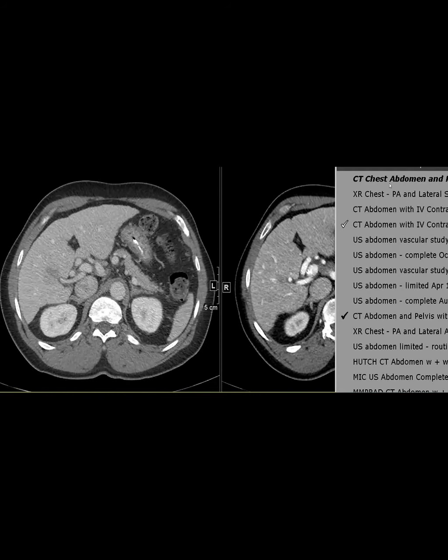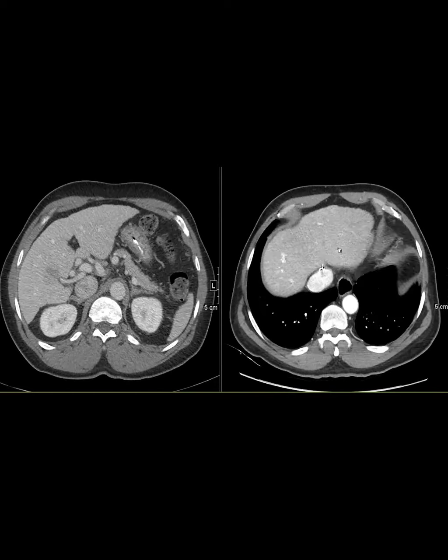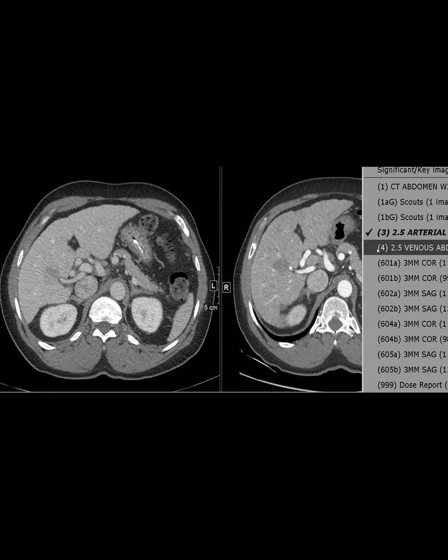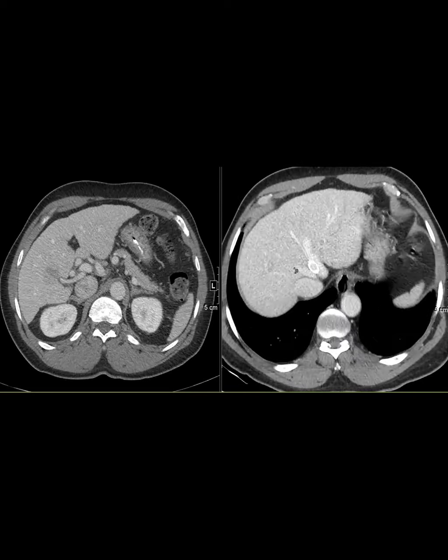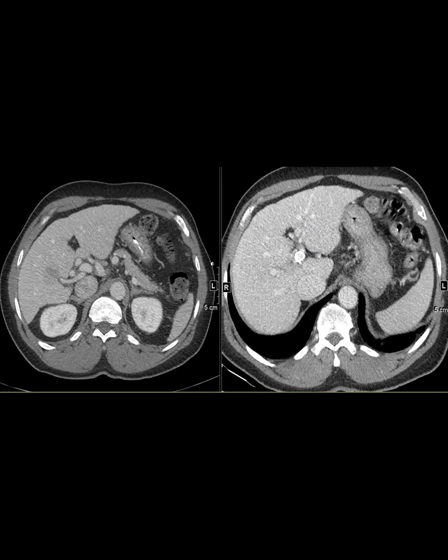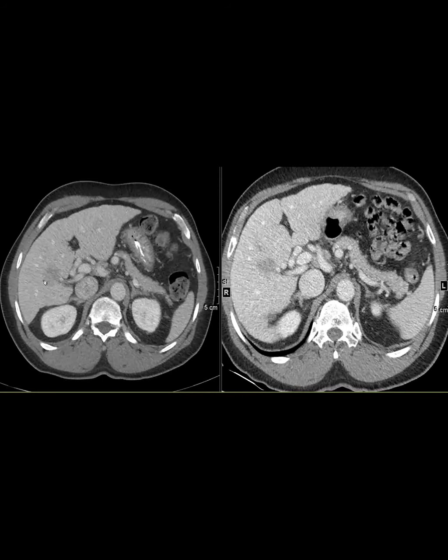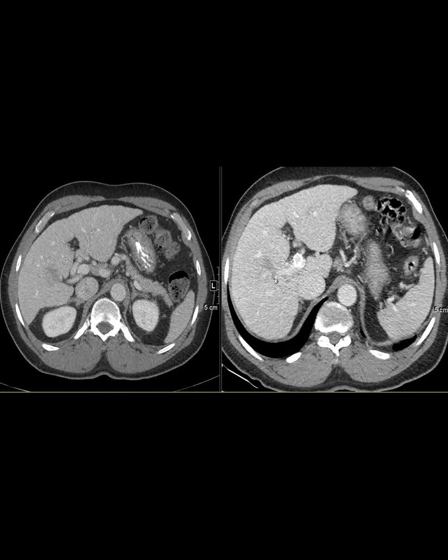So the follow-up study, 6 months after this, is a little worse kind of mistake, because if you look carefully, you see that there's already tumor in vein in this case. So 6 months after the initial study, you can see that this has a little more oomph to it, right? And you can see there's a little bit of tumor invasion here and here.